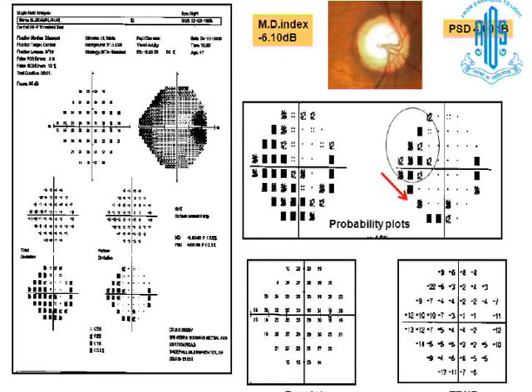And for management, when you see a black square in the probability plot, it doesn't mean it is an absolute scotoma. It only indicates the loss of retinal sensitivity is more than 5 dB or 7 dB or 8 dB, that means it has a p-value of less than 0.5%. Any deviation value of more than 7 or 8 dB will have a p-value less than 0.5%, and it is represented by a black square.